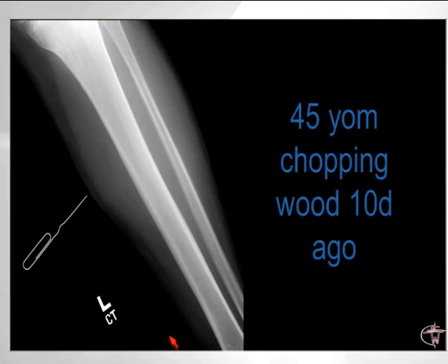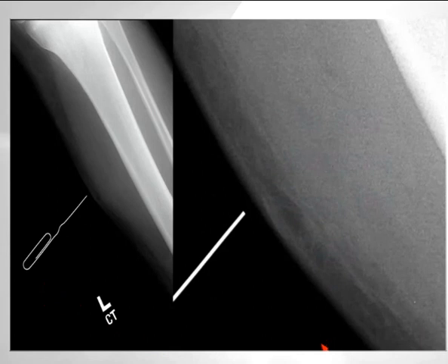And I have to commend our technologists who have put a paperclip right where the area of clinical interest is. That turned out to be very helpful, because if I blow up this image, you see that actually embedded in the skin was a small foreign body that is slightly more radiopaque because it has been sitting there for several days soaking up fluids.